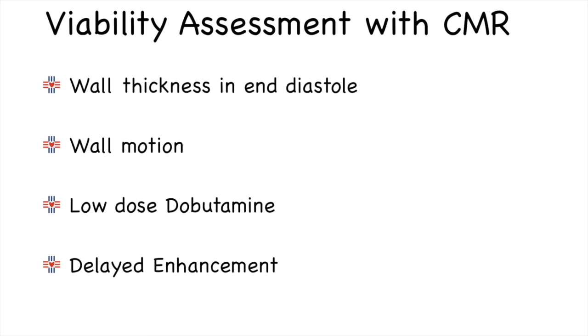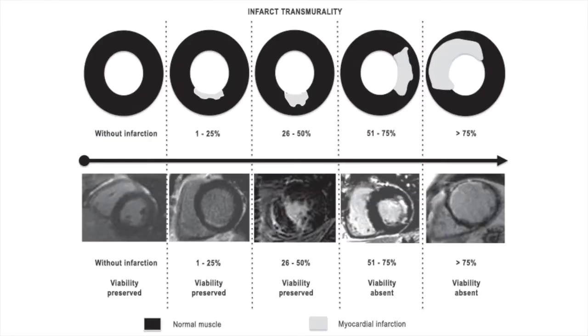We look at the wall thickness in end diastole. We look at the wall motion of the segments. We also look at the delayed enhancement imaging. And in doubtful cases, we would use low-dose dobutamine stress to assess for viability.